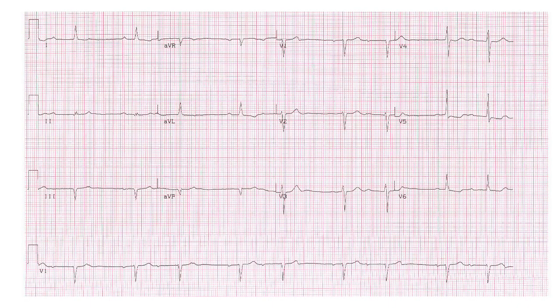Moving on to this EKG, it clearly is not regular. If I'm looking at the rhythm strip at the bottom, which in this EKG is lead V1, this clearly is not regular. How do I know that? If I'm looking at the R to R intervals between beats, if I were to measure this R to R interval, I'm going to call this R to R1. It is clearly longer than the next R to R interval. I'm going to call this R to R2.